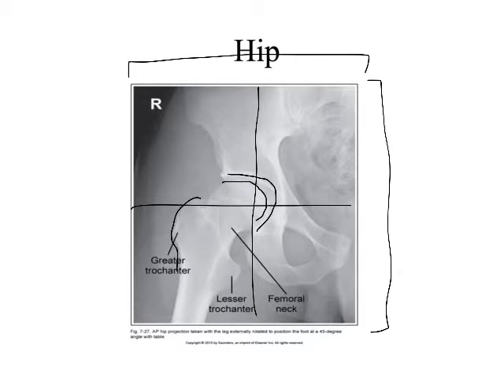Is it square? It's square. That's helpful. Look at the anatomy. What anatomy have we included on that medial border? Yes, part of the pubic. Yes, we get to see this portion of the pubic symphysis. So what do we call that little guy down there? This bone right here that I just included, this portion of the pelvic bone.